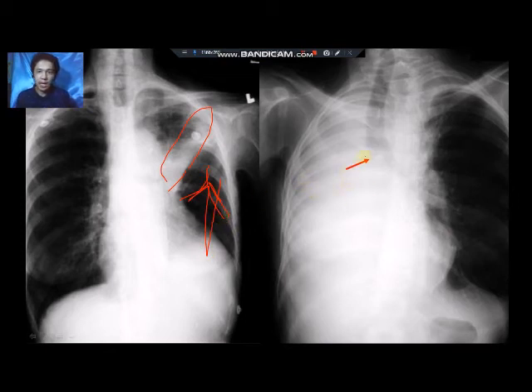And if butan nato all of your lungs has collapsed, no, all of the lung tissues has collapsed, so wala na gid siya sulod nga hangin, then the effect will be this. Okay, so muna iyahang epekto kung ma-collapse na gid tanan ang ato ang lungs, diba? Kabantay mo sa iyang trachea, medyo nag-deviate na siya.